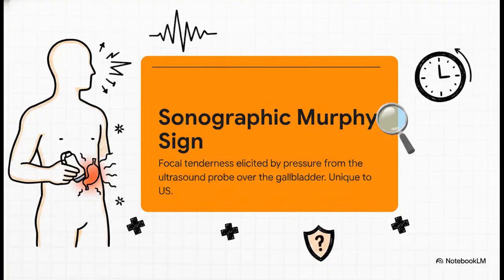And this is where ultrasound's real-time ability becomes like a diagnostic superpower. There's something called the sonographic Murphy sign, and it's a dead giveaway for acute cholecystitis. Here's how it works. The person doing the scan gently presses the probe right over the gallbladder, and if the patient feels a sharp, very specific pain right there, that's it. You can't do this with a CT or MRI. It's a unique and incredibly powerful thing you can only do with ultrasound.